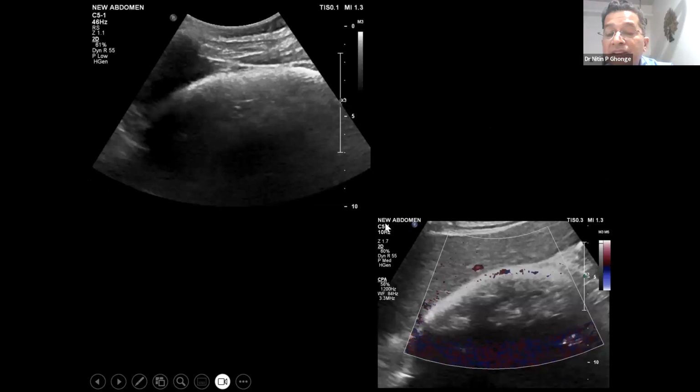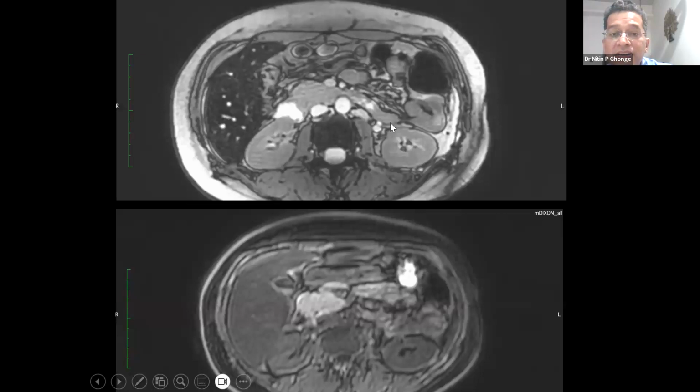Another example, whenever patient is very sick in a septic state and ultrasound is not able to show the kidney like this. This is the renal fossa. Patient had no surgery, no nephrectomy. Otherwise, patient was all right few days back, and the kidneys are not seen at all despite lot of efforts, and very faint renal tissue is seen in an adult age because of the significant air interface in a sick patient. So it should always be suspected that there is some emphysema in the renal parenchyma, or there is something called renal cortical necrosis.